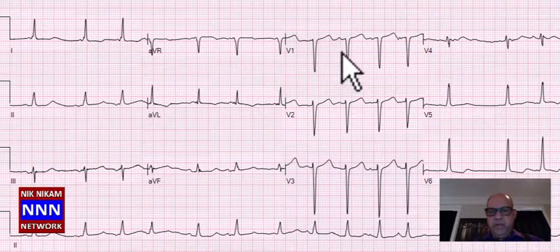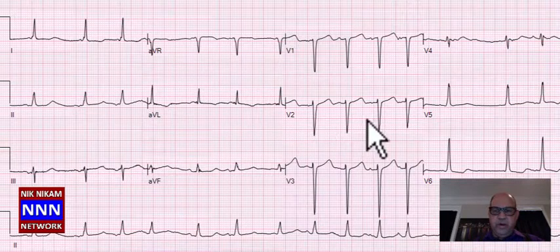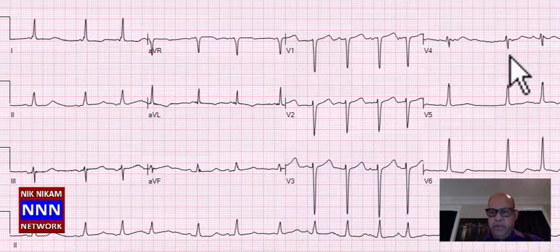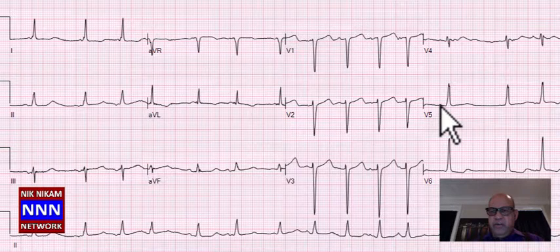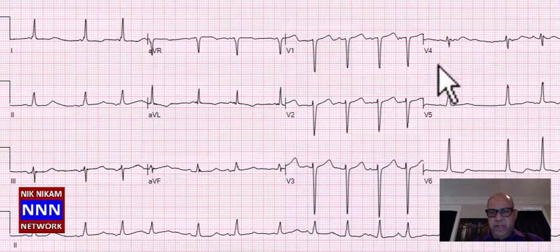Okay, we have sinus rhythm, but the RR intervals are varying. So you wonder, is this atrial fibrillation, or sinus rhythm with atrial ectopic beats, or are we dealing with a Wenckebach, something like that. But it's very hard. Unless we have a long rhythm strip, we may not be able to discern the underlying varying changes in the RR intervals. But with the strip that we have, I can say this is a sinus rhythm with PACs.